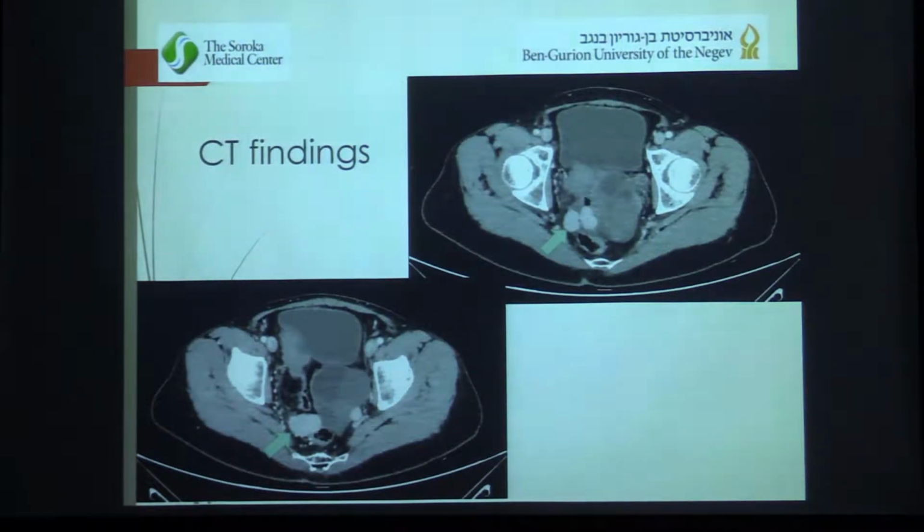If we look again at the lower slices on the axial CT, we see that the left ovarian mass is now more clearly defined. It's, again, multicystic with different densities of different fluids. However, we see now the solid component is separate, and it's one of these peritoneal implants. It's actually the largest one, which is about 3 centimeters in diameter.